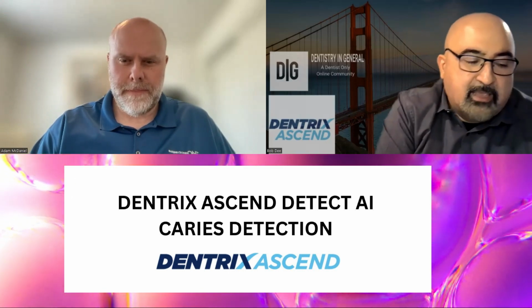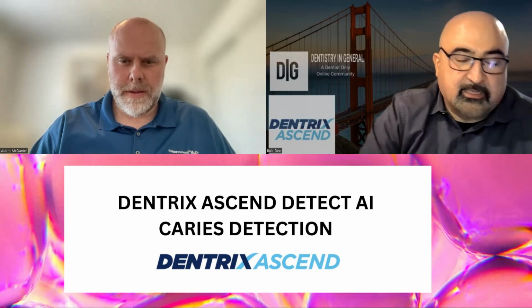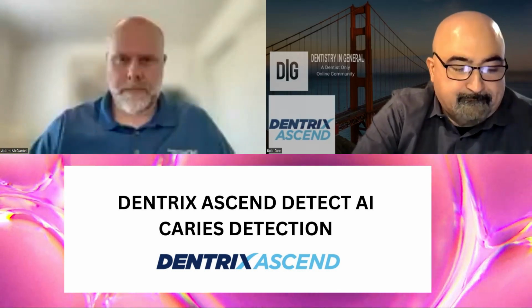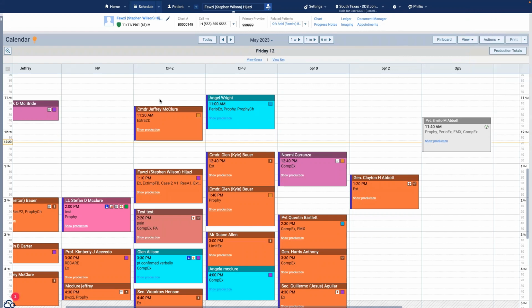I've made you co-host, so go ahead and share your screen if you don't mind, and I will try to ask you questions regarding this whole technology that I've been using for almost a year now. Can you see everything? Yes, we can. So this is basically the schedule for Dentrix Ascend, right?